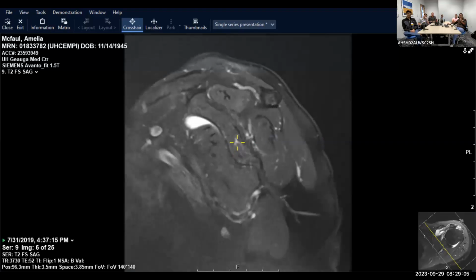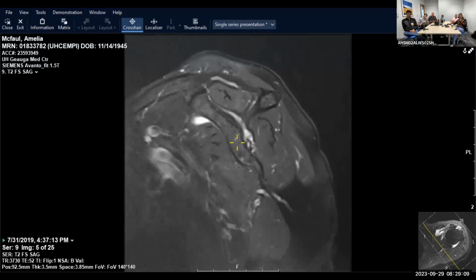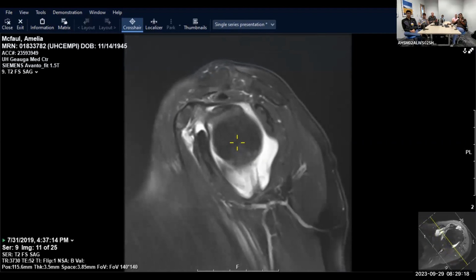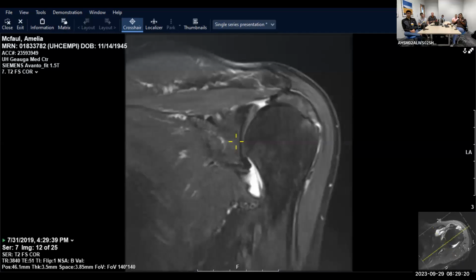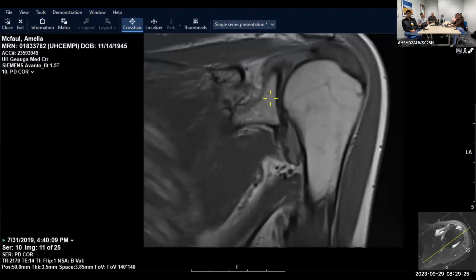And so if the suprascapular nerve is impinged at the suprascapular notch, you get supra and infra atrophy and edema or denervation. If it's at the spinoglenoid notch, the supra has already been innervated, so it's just infraspinatus. The other thing is your quadrilateral or quadrangular space, where you want to look at the T1s because the fat planes are nicer.